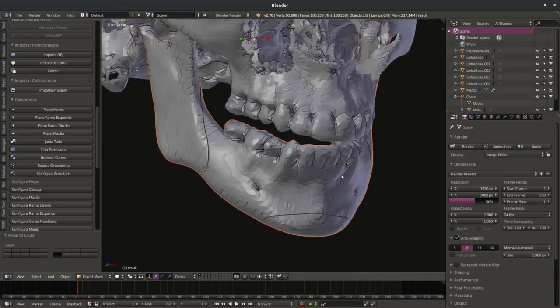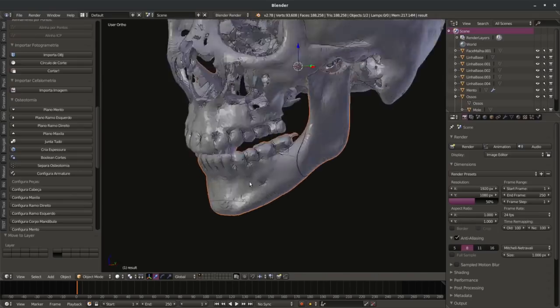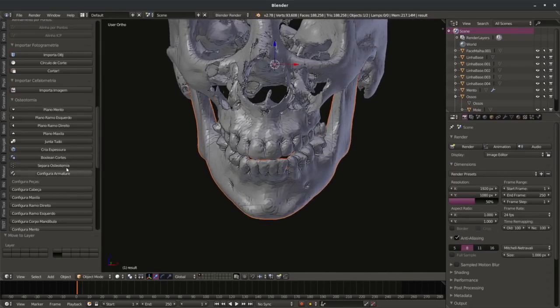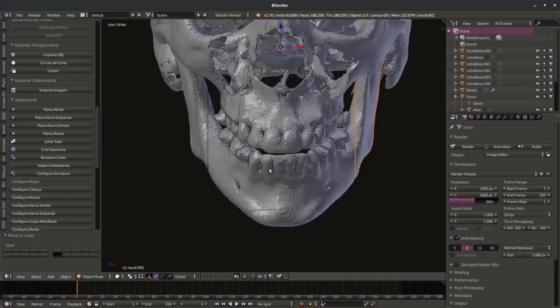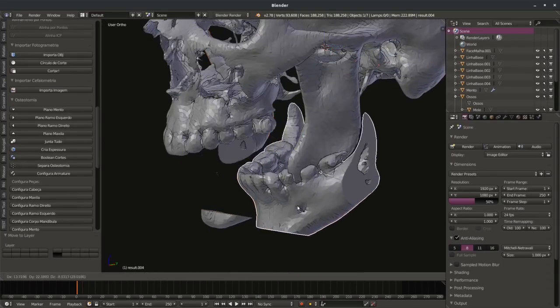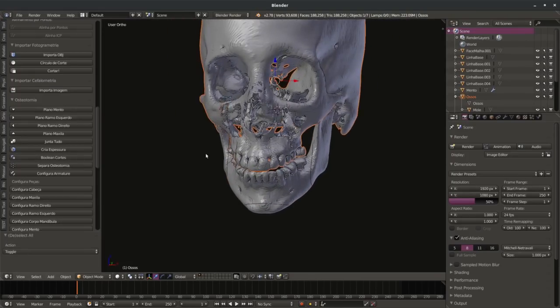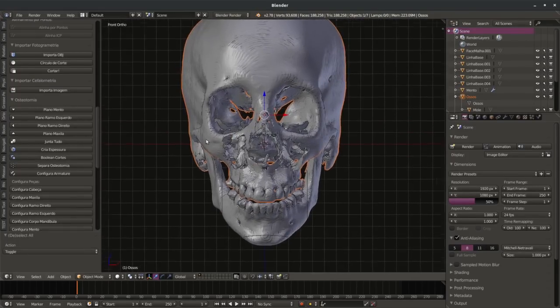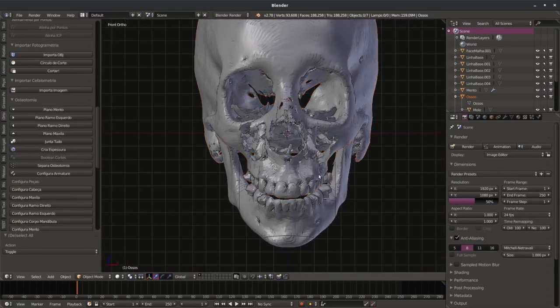Well, the osteotomy was done, but the mandible is only one object. To separate this object, we have to click here in Separa Osteotomia, that is, separate the osteotomy. You click, wait a little, and after we have 3 different objects, like you can see here. Okay? Now we have to cut the superior part, the upper part. We have to cut the maxilla.